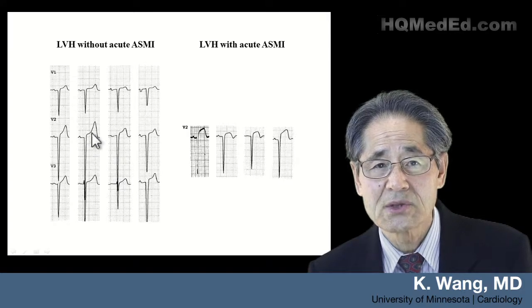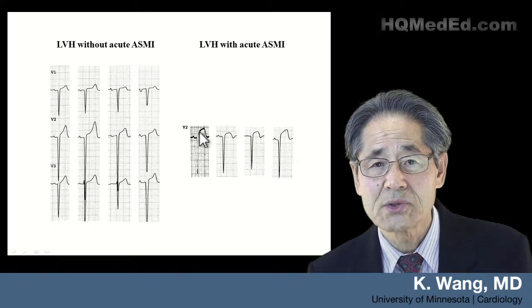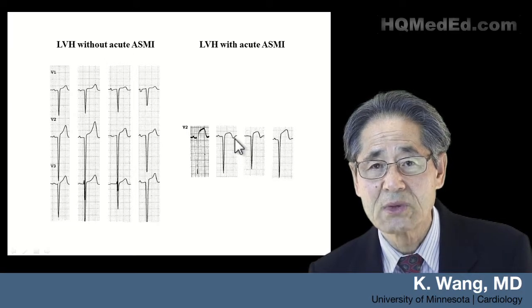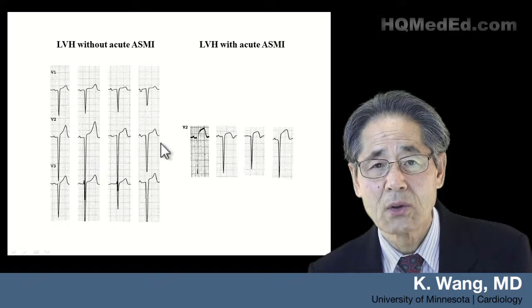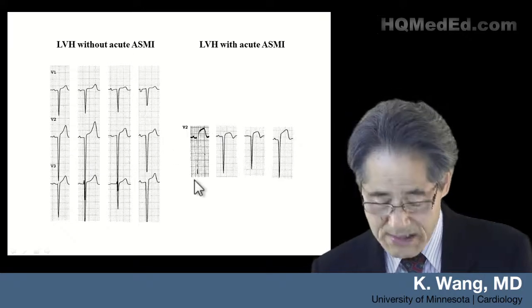Here the ST segment is all concave and T wave is upright. Here the ST segment is convex, and better yet, T wave is inverted, which means it's concordant with the deep S wave here. So appreciate LVH alone, LVH combined with acute MI.